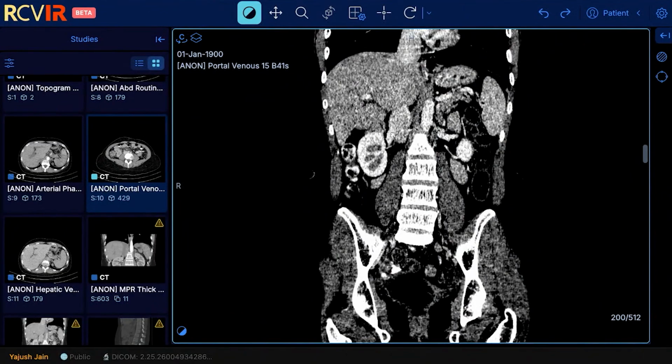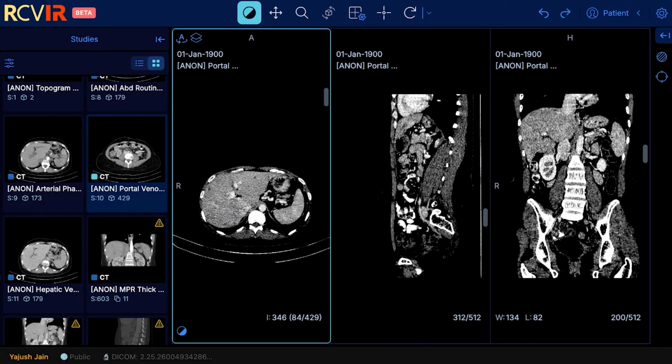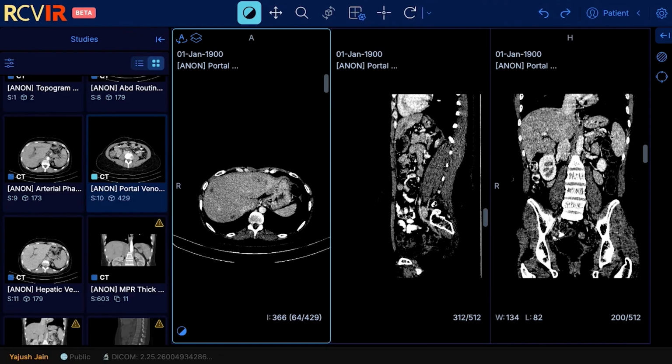As the main outflow is blocked, because of the blockage of the main vessels, the parenchyma of the liver goes into shock. If you also look at the enhancement pattern, you can see that there are early changes of mottling, and the liver is a little bit hypointense compared to what it would have been in a normal case.